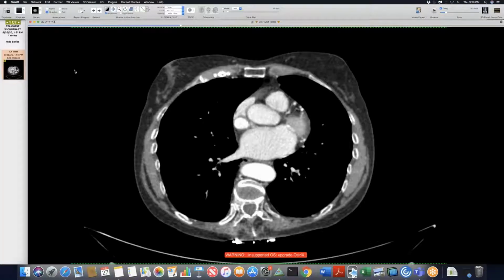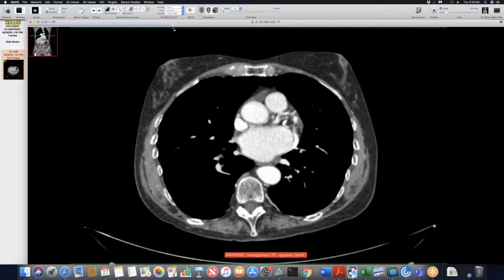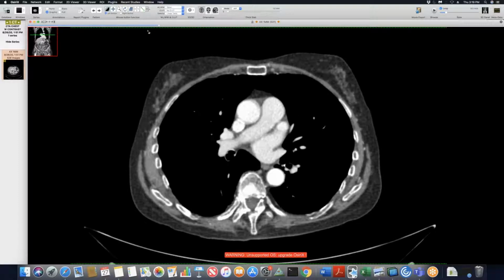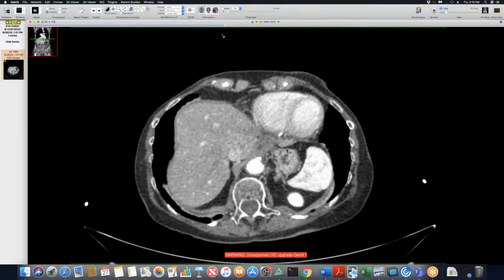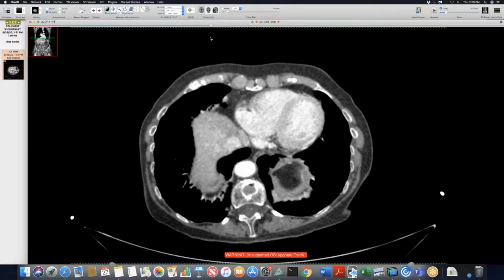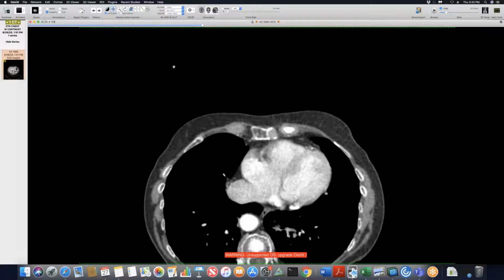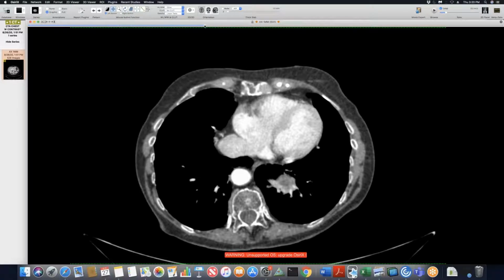All right, I'll start off with this one. This was a TAVR CT that was read yesterday by Art Stillman. He made an interesting incidental finding here. So the abnormality is right here, and you can see this junction of the inferior vena cava as it comes up. You have this abnormal contour right there, right next to the right atrium.